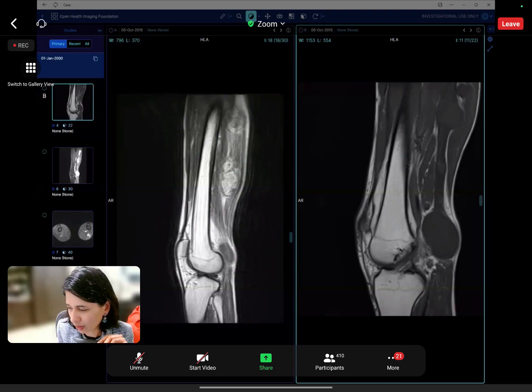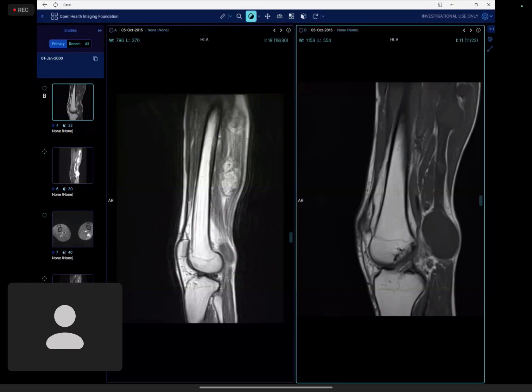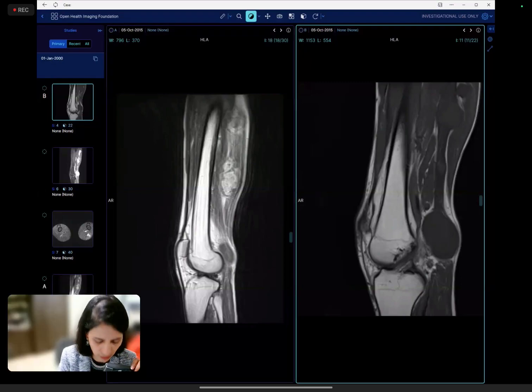The manifestations are multiple neurofibromas, plexiform neurofibroma, tibial pseudoarthrosis, scoliosis, and kyphoscoliosis of the dorsal spine. There could be multiple spinal nerve neurofibromas or associated meningocele.